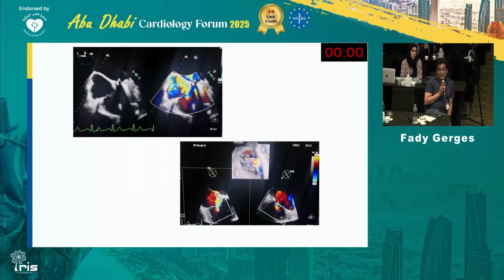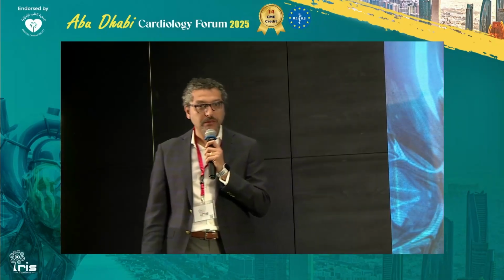So it's a 47-year-old guy, and the diagnosis of HFpEF needs to be thought about. The second thing, clinically, it is also giving a picture of hemolysis, what you have shown. And the third thing, this clip application is a relatively safer procedure. So the interventional team should be given a chance, if they can occlude it properly. You mean occluders, not clips? Occluders. Yeah, PDA occluders.